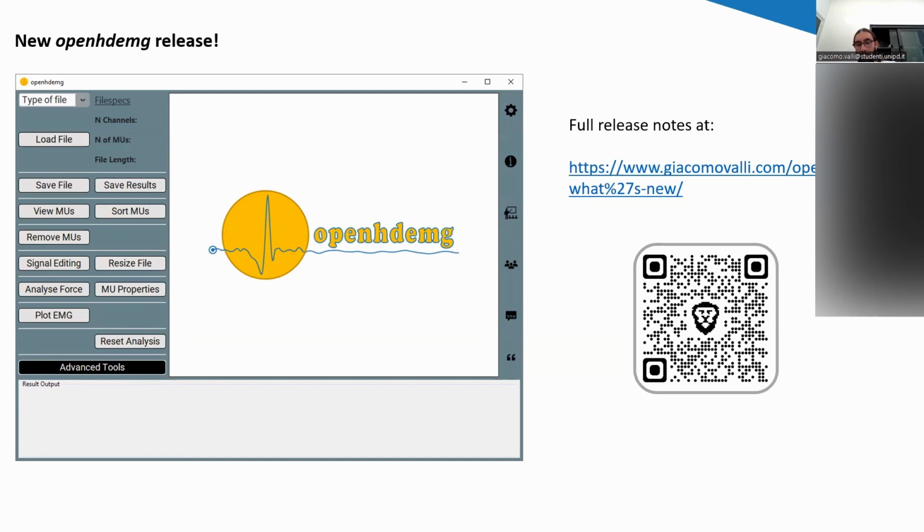So now it is much more stable and reliable. Everything is working better, and it also has an important button, as you can see here, which allows you to customize the execution of the functions that the GUI is calling, so that you are using the GUI, but you are one step closer to using the library because you can start adjusting some variables and parameters.